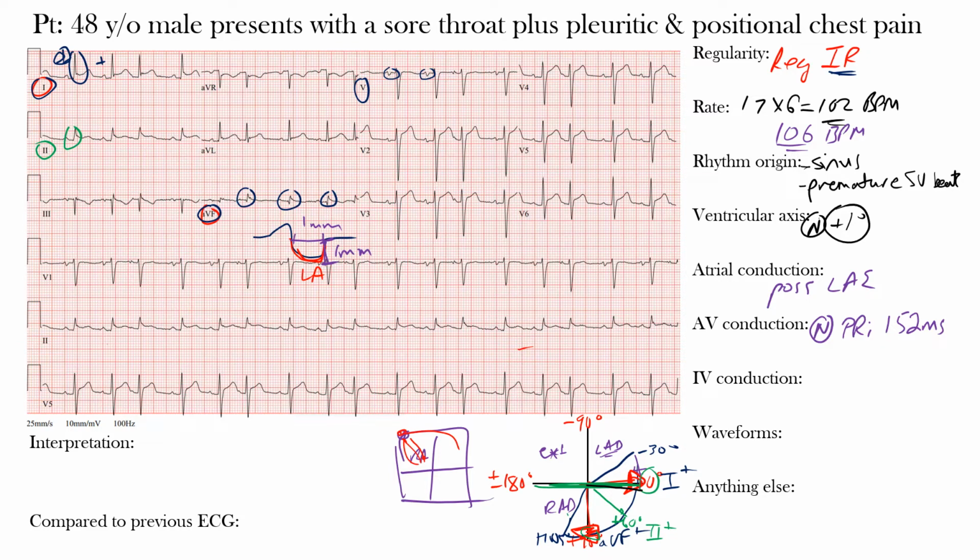Now let's look at the intraventricular, or IV conduction. In this case, we're looking at the duration of the QRS complexes. The normal QRS duration is often between 70 and 110 milliseconds, or 2 to 3 small boxes. Some may consider the upper limit to be 120 milliseconds. Anyways, the main thing we're checking for here with intraventricular conduction is whether or not the QRS interval is prolonged.